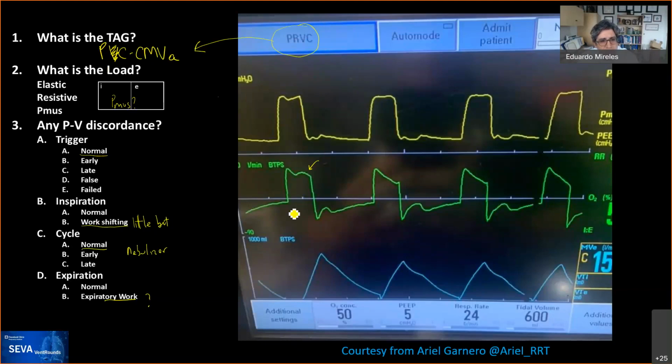That means that they are triggered or cycled by the ventilator, which is the case here. They're all triggered, so they're mandatory. And adaptive means that the caregiver sets the tidal volume. Here they set the tidal volume, and this is a target, not the absolute that the patient will receive, and the machine will move up and down the inspiratory pressure to achieve that target. That's why it's called adaptive. So I think that you're 100% correct here.